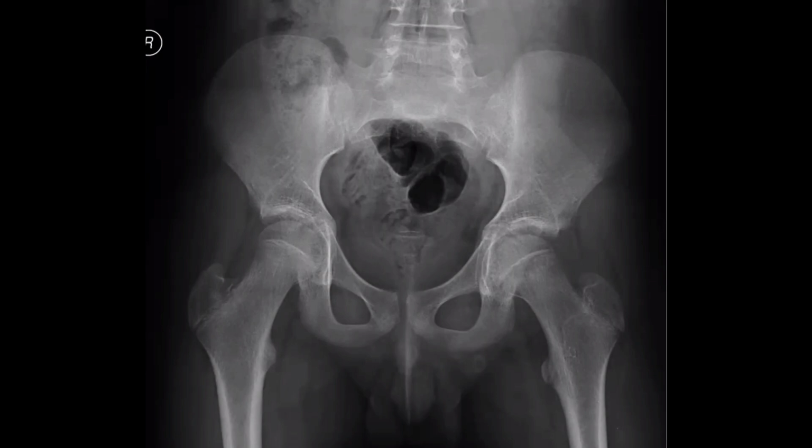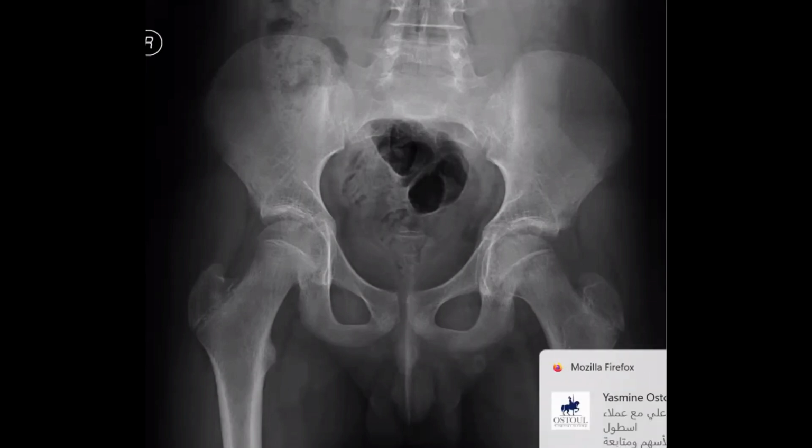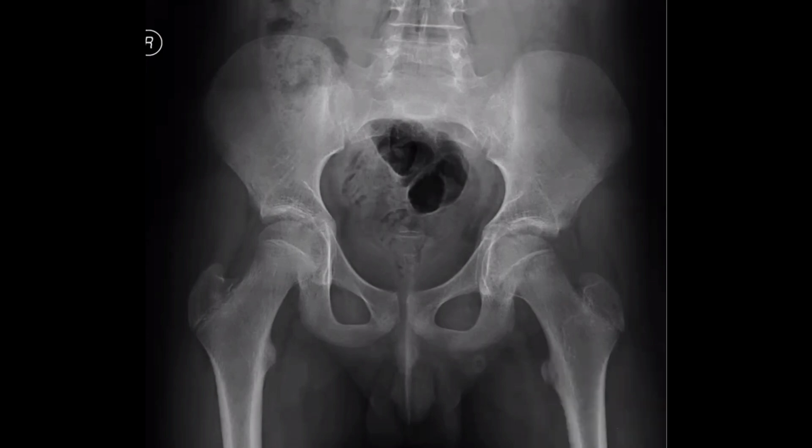Sir, I would like to have a view of the left side to see whether this is avulsed or just unfused. Apart from that, I notice the reduced density and there is fuzziness or haziness along the cortical margins of the hip. The pain is localized at the left hip joint. These two things I find abnormal, because here the tuberosity looks fused, but here it looks unfused, so it could or could not be an avulsion.